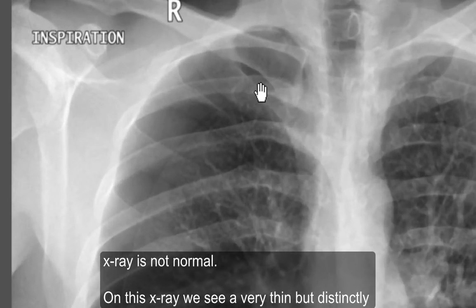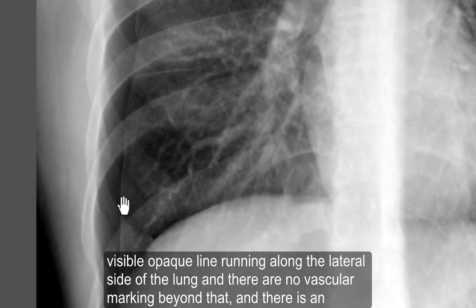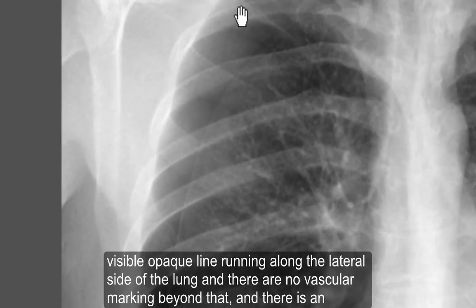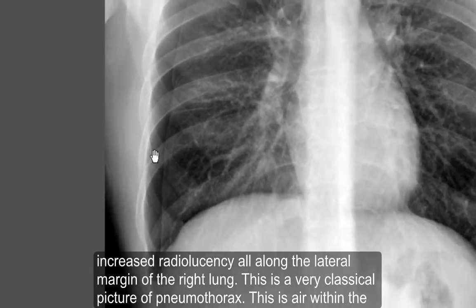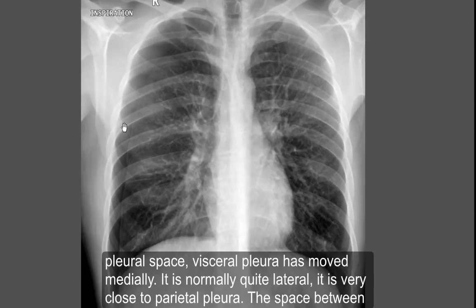Okay, on this x-ray we can see a very thin but distinctly visible opaque line running along the lateral side of the lung, and there are no vascular markings beyond that line, and there is an increased lucency all along the lateral margin of the right lung. This is a very classical picture of pneumothorax. This is air within the pleural space. Visceral pleura has moved medially. It is normally quite lateral.